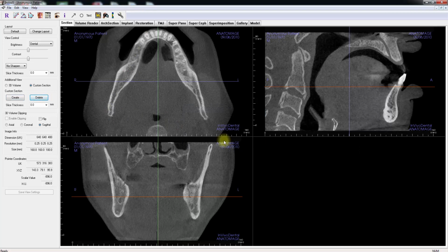If you will be making surgical guides with us, please note that the scan resolution must be 0.3 or below. The resolution of the scan is only displayed here. To change the resolution of the scan, please check the settings of your scanner.